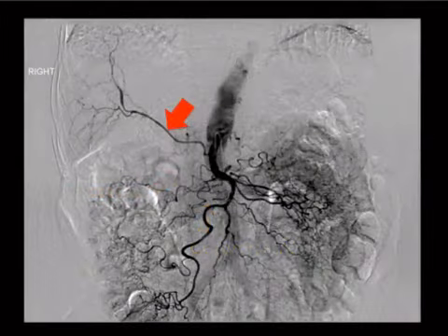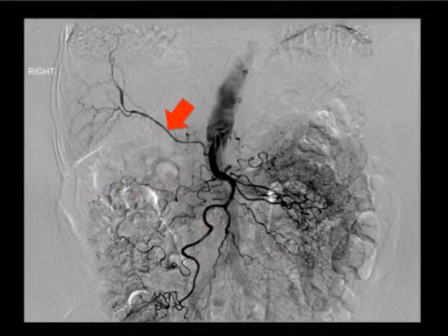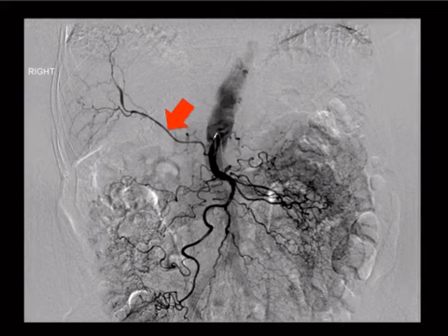So what about this guy? This is another hepatic, but this is different, right? So question number one, where's the catheter parked? Doesn't look like that celiac injection, right? So if it's not a celiac injection, what's our second guess? It's an SMA injection. All right, so this is what an SMA injection looks like. So we've got the hepatic coming off of the SMA.